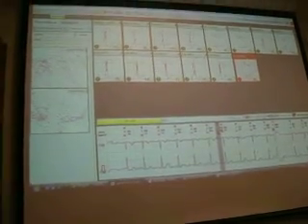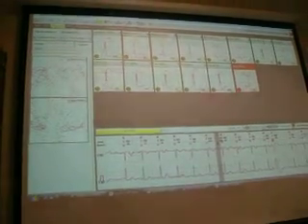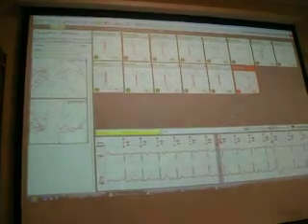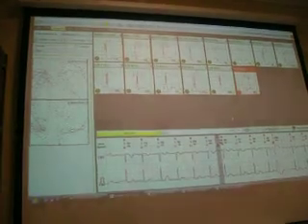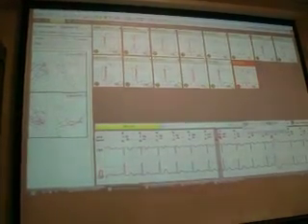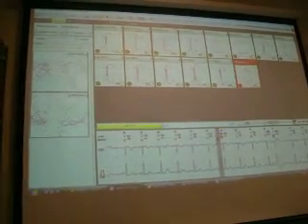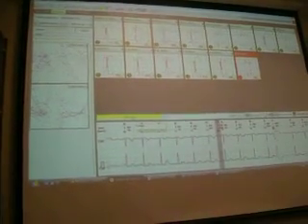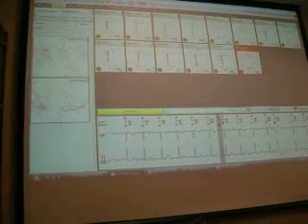Fixed button means if I want to rename the cluster type, for example noise, I can do it except for the QRS which are fixed. I will show it. This is the cluster, and this is the first QRS in the cluster, and we can check if this is a noise.